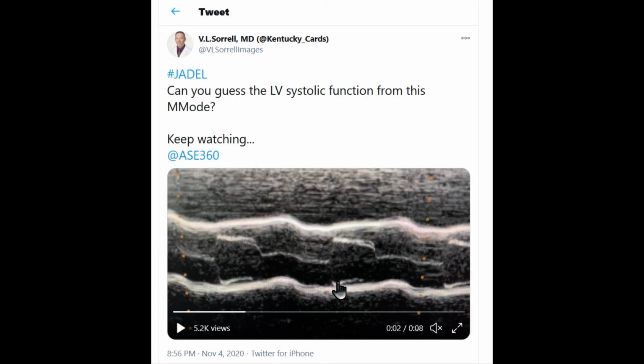A number of people posed a number of possibilities that should also be considered. I think I heard bicuspid valve, but typically with a bicuspid valve, you will have eccentric closure, although you don't have to. This is pretty midline. Eccentric closure might have a line that's up at this end or at this end, depending on the type of bicuspid valve.